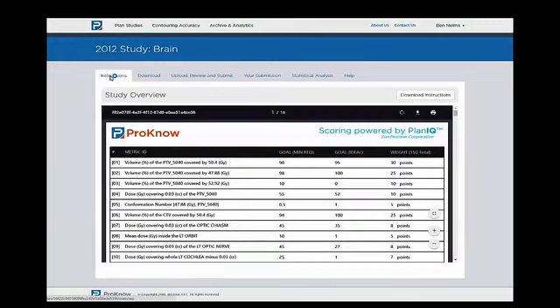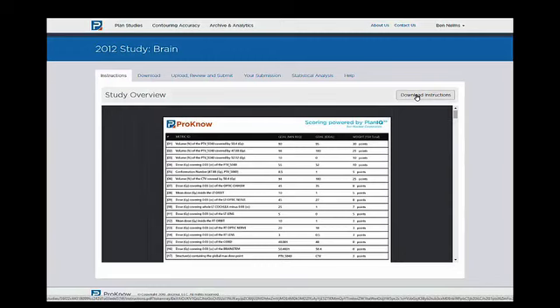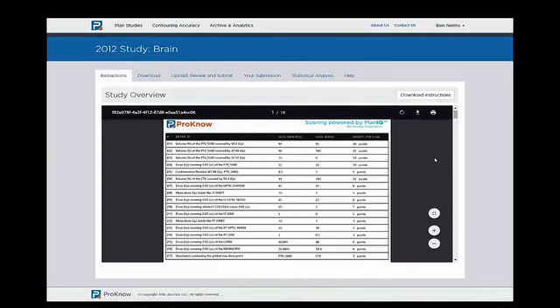This will guide you into the first tab, which is the instructions. You can go through the instructions here in the window, but you'll probably want to have those on hand, so just click download instructions and it'll download a PDF that you can keep on hand or even print out if you need to. This will have instructions, background of the plan study, what the plan metrics are, everything you might need to know to get started.